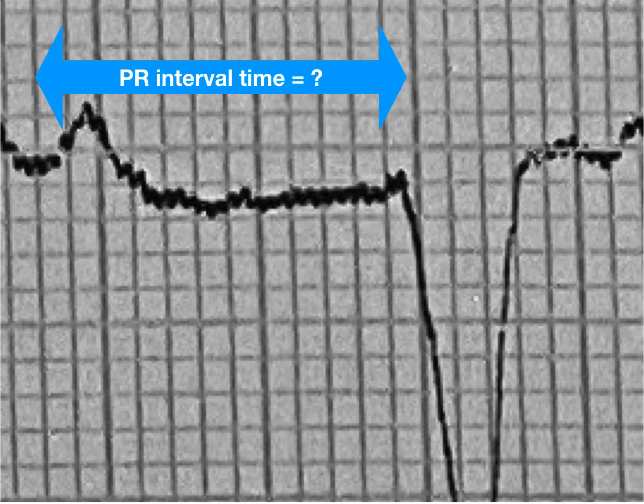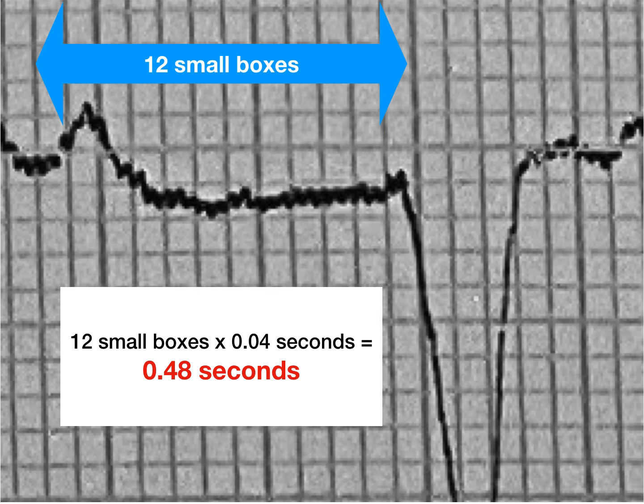Today I bring you two practice examples. In this first ECG, you can calculate the PR interval. Okay, time's up.